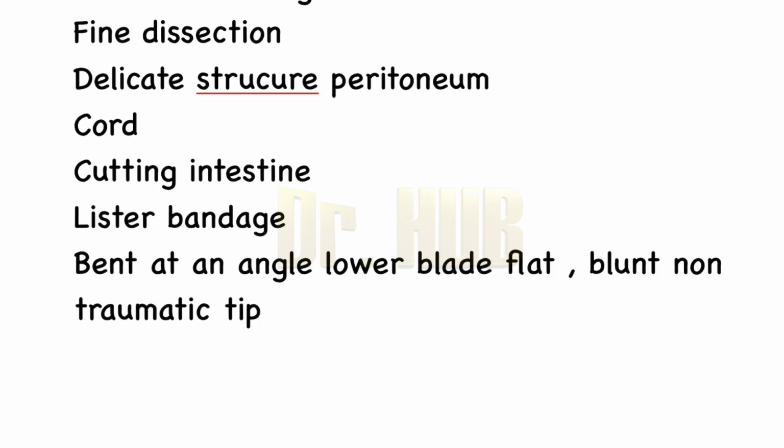So what is the use of this Lister bandage scissors? The use is for cutting the bandages.